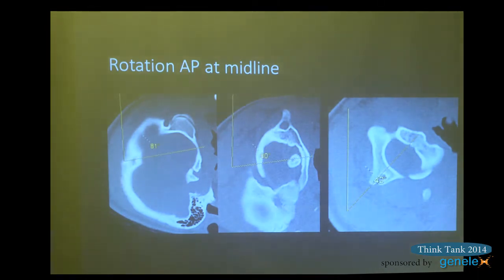And these are measurements that I would be doing in an axis perpendicular to the anterior posterior dimension for the vertebral body. I'm measuring about 80 degrees, and this at a perpendicular is about 40 degrees, 42 degrees.